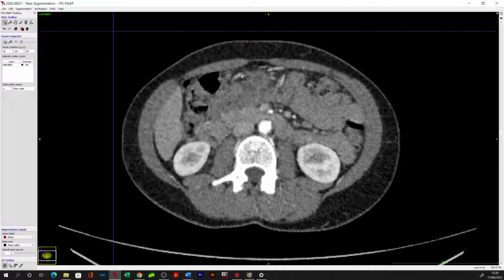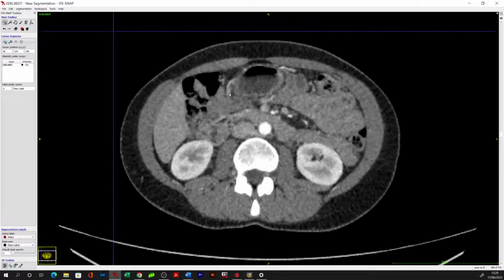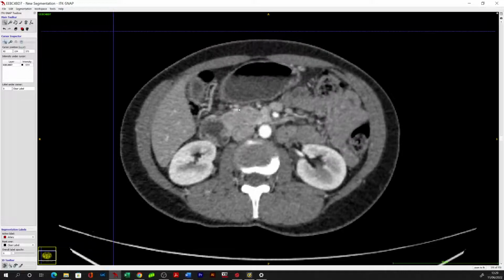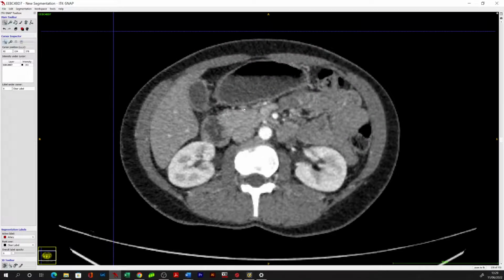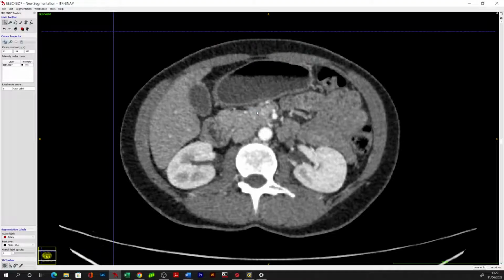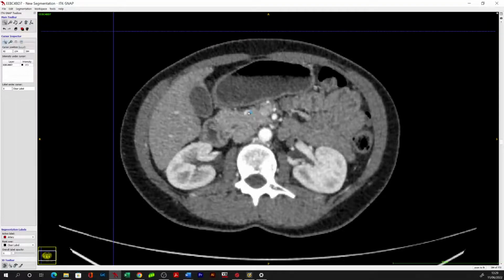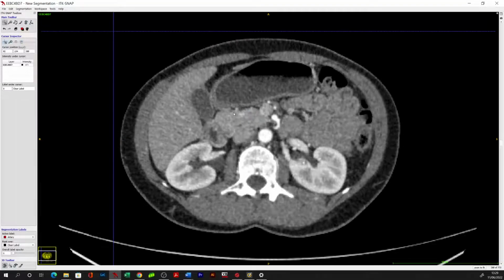And you can probably differentiate, there's two vessels here. So the smaller, more intense vessel is going to be the artery, because we know we've got an arterial phase. But also the veins in general are going to be larger. And we can follow this going back, and this is eventually going to probably insert into Henle's here.